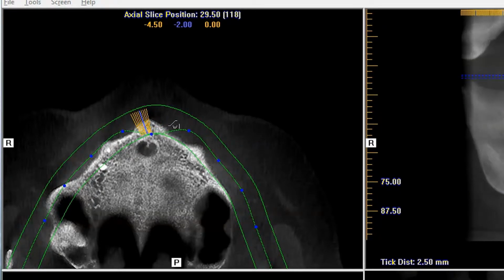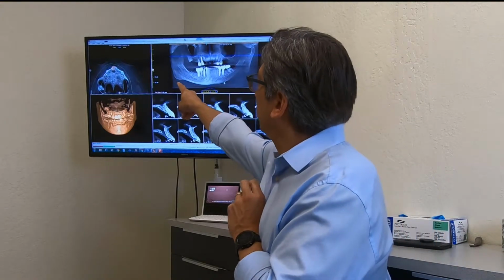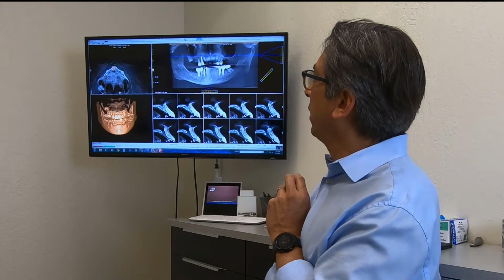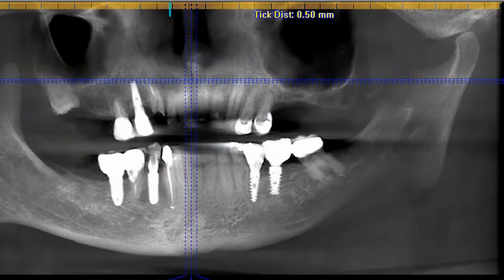So you have to reshape this arch view so that we get a good view of the arch that we're looking for. I'm only going to do half the arch here so you can see the difference. This is the right side of the patient. This is now the left side. There's a little R that indicates the right side. Now, see how much clearer this section is?